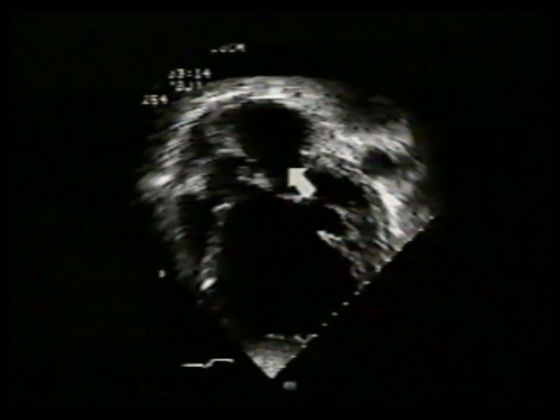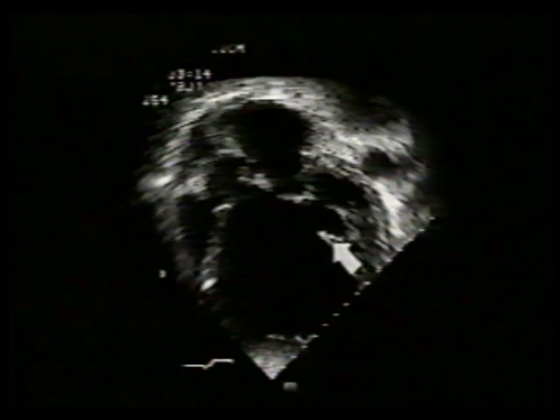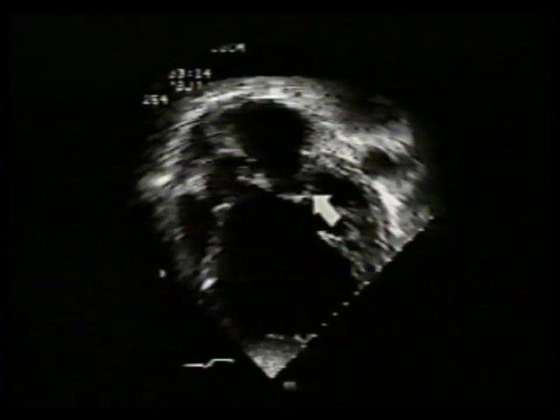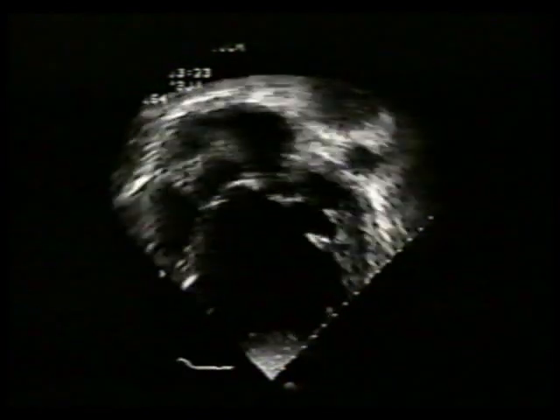Significant left ventricular enlargement results in dilatation of the mitral annulus and in malpositioning of the papillary muscles in relationship to the mitral leaflets, resulting in incomplete apposition of the leaflets. Hence, some degree of functional mitral regurgitation is present in most patients with dilated cardiomyopathy.